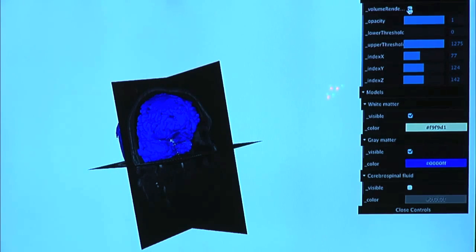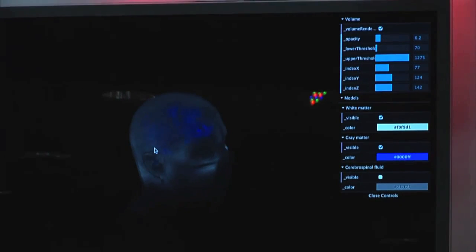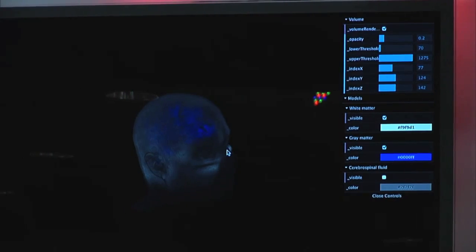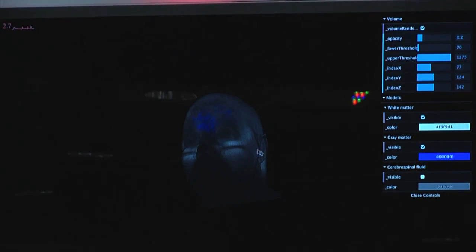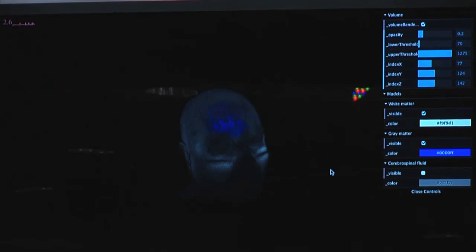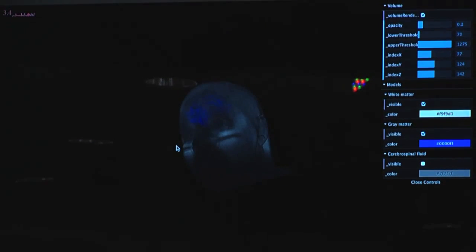Now if I do the volume rendering, yes. I think it looks quite cool to see through the opaque surface, the brain surfaces, the blue ones. So that's 4.5 million vertices, like 1.5 million triangles, and we get low frame rates, but that's expected. You can look into the ear to see the brain. That's badass now.